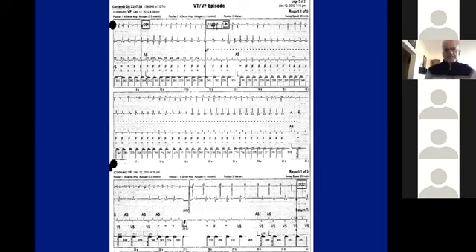It was during the reconfirmation that it delivered a shock. But the teaching point here, interesting point here, is that atrial fibrillation can sometimes set a nidus for ventricular fibrillation. We've seen it in some old device trials that patients who were in atrial fibrillation would more frequently go into VF. So here it goes into VF, and then the device shocks, and the shock actually restores sinus rhythm. AFib was terminated, even though the shock was delivered after VF or flutter stopped.